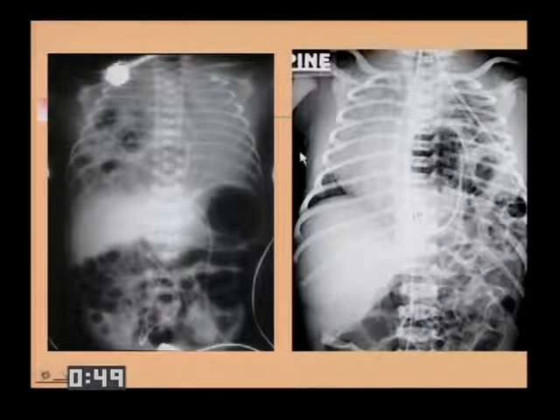They each have compressed the ipsilateral lung. They each have shifted the mediastinum from one side to the other and have resulted in contralateral lung hypoplasia. They both would, in this instance, be surgical, neonatal surgical emergencies.